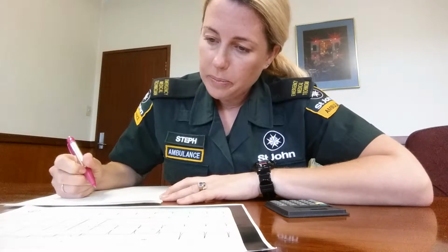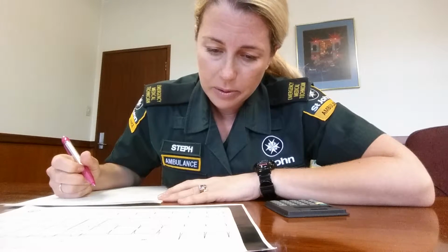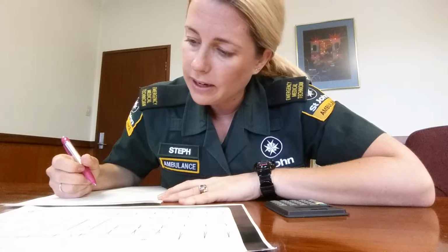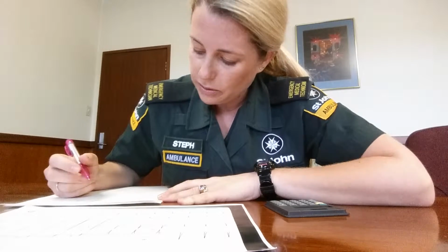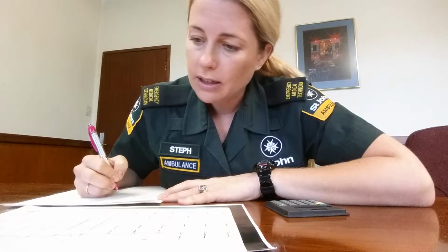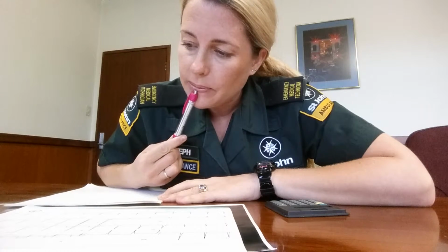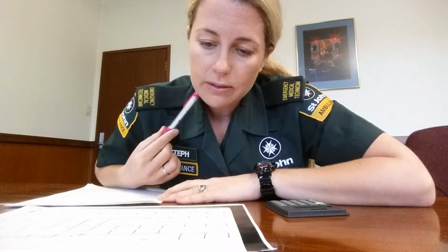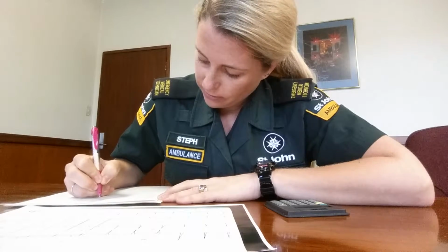Morphology would be the QRS complex. So the intrinsicoid deflection is a little bit prolonged, but it's pseudo as that's coming from the delta wave. We don't have any bundle branch block criteria met in V1. There's no bundle branch blocks there. Hypertrophy. So I'm looking for the Sokolow-Lyon criteria. V1 and V5, which looks like it could be, but also it fits in lead 1 is greater than 12 mm. So we do have left ventricular hypertrophy.